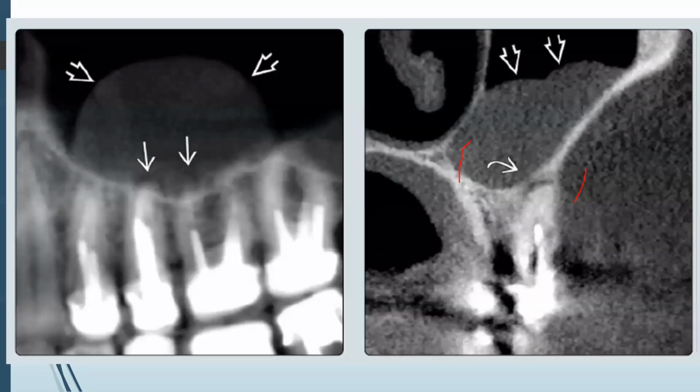See, as I said, when the lesion is involving the maxillary premolars and the molars, and you see some halo inside the cystic cavity, then you have to suspect that there are two pointing arrows. That means there is some amount of radiolucency which is surrounding the root apices. So that means it is associated with a rarefying osteitis, and that's why there is kind of irritation to the mucosa of the maxillary sinus, and that's why it has caused a hyperplastic change.